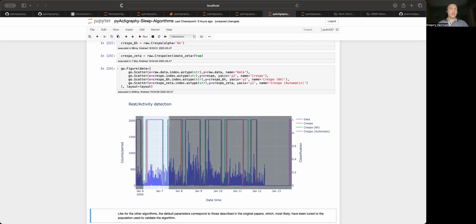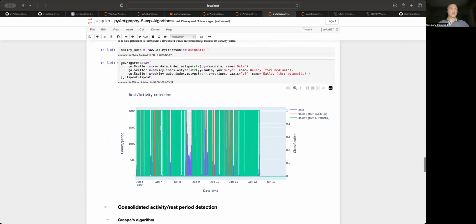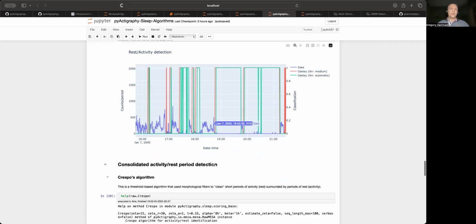And that's actually a nice feature, because you might want to say, look, I want to know, and then maybe within this rest window you want to do something. But for that, you need to identify it. You need a start and a stop, which is much more difficult if you get something like this. When does it start? When does it end? You can see that it starts to be consolidated here, but detecting that in an automatic fashion is maybe not that easy.